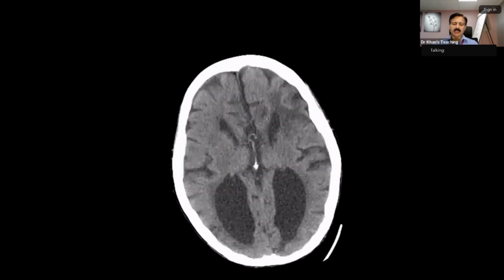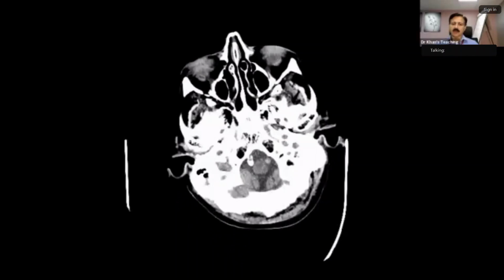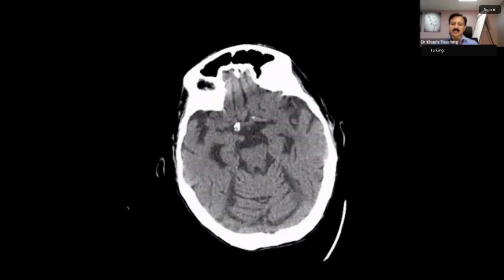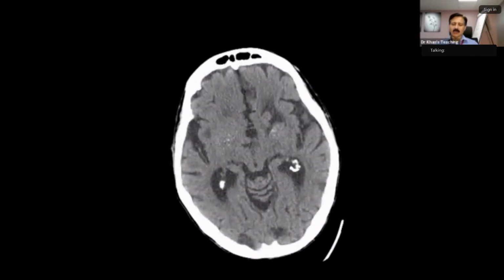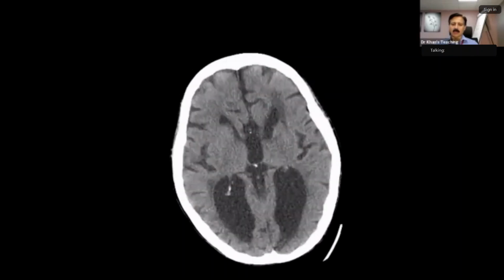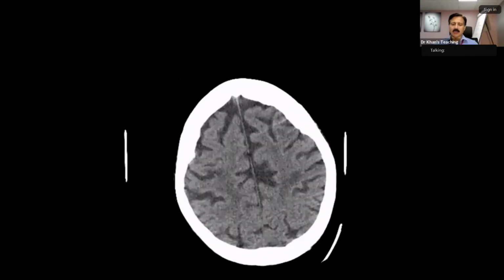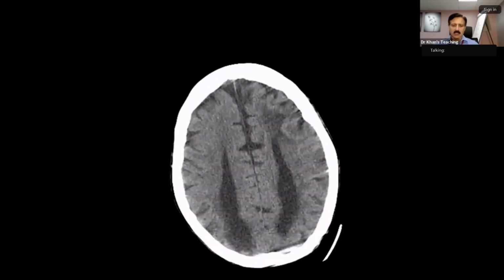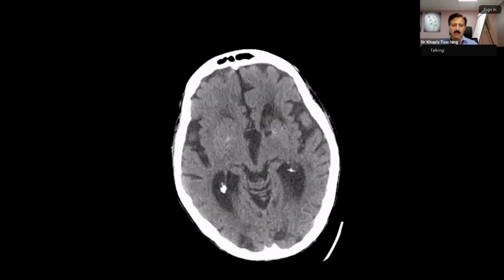And you see, this is the type of case which, if I have got it as an examiner, I will like to show you. Because this is a 73-year-old with a corpus callosum agenesis, complete agenesis. And the point is that I will open an axial slice and you will go up and down and say that there is atrophy, this is small vessel ischemia, blah, blah, blah.